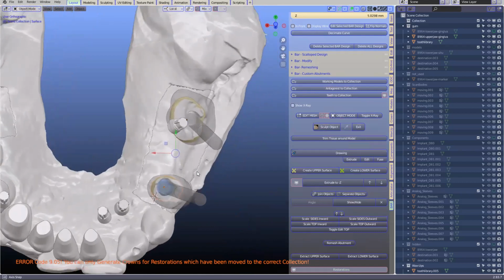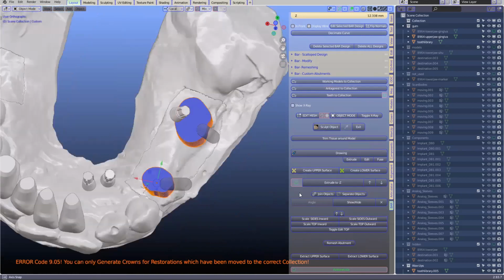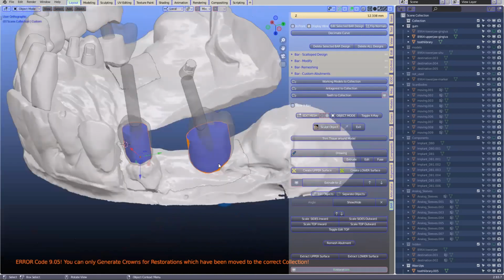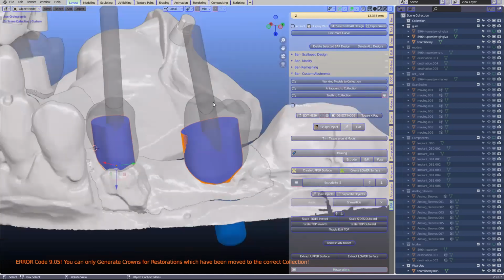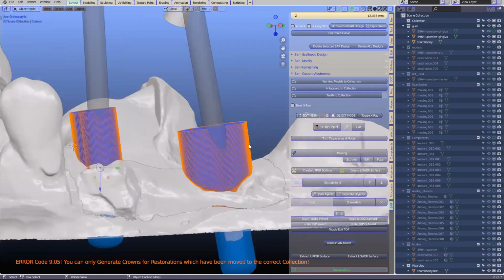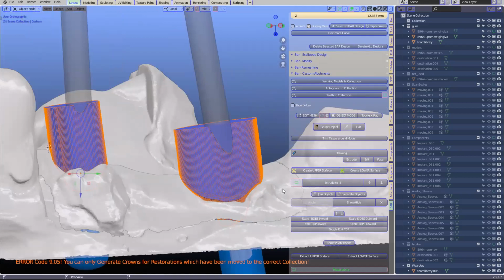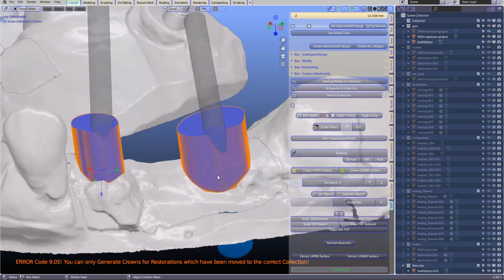I mean, you can always pull the crown out a bit later, when you go into the crown and bridge module, can't you? Because then we're working with a safety zone again. That's 100% correct. This time around, I'm not going to mark the angle, because we've already discussed that. But can you show us occlusally if we can narrow it? I think that was a question.